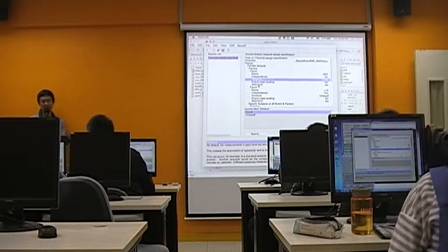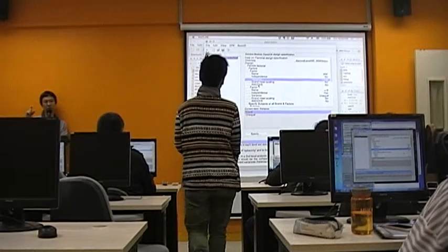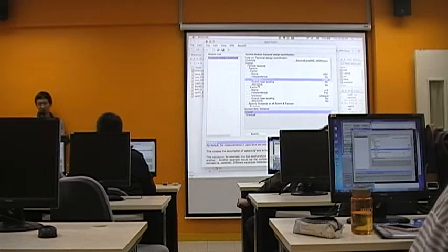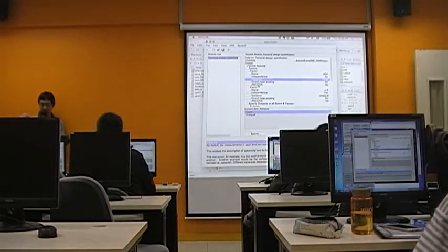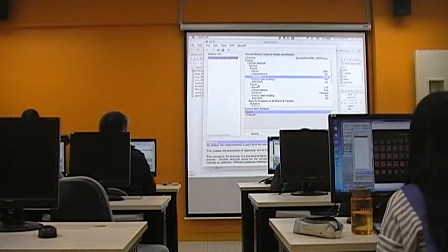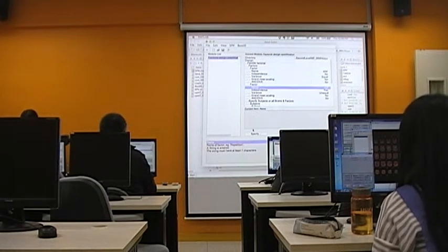No, it's not defined here. You simply define your factor first. You just need to define whether the factor is independent or not, and then you define whether the variance is equal or not. Okay?